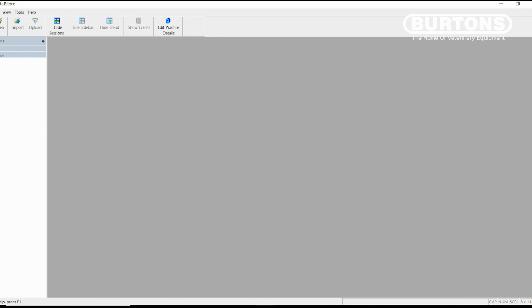Now, if you were running Vital Monitor and there was a live session running at the moment, then live would be full of all the data files that have been recorded. And this would enable you, without stopping the Vital Monitor recording, to pop into VitalStore and actually review the data that's been recorded at that point. So if we had live files down here, and one of them is ECG, we could double click on the ECG and we would see all the recorded ECG data up to the point where we clicked. So it gives you a way to look at data without stopping the recording, but with the ability to look in great detail. Otherwise, any files we open will be shown in the session down here.